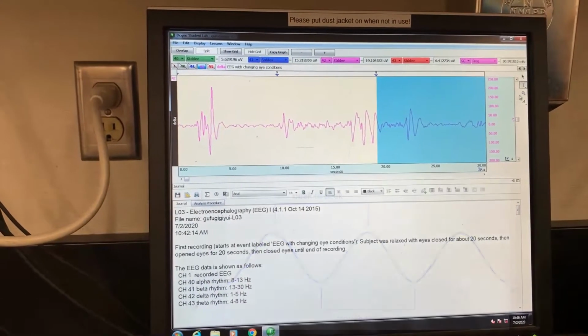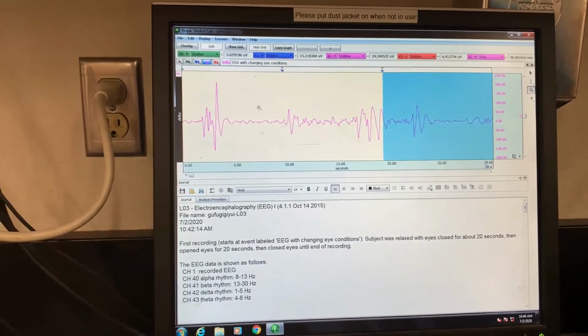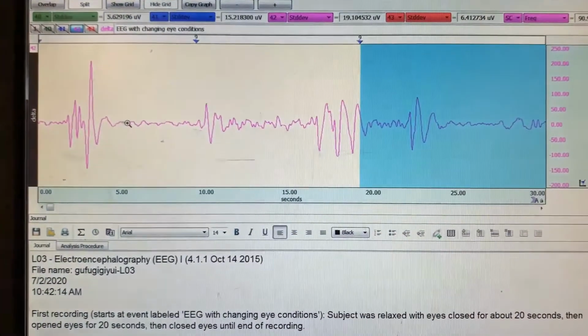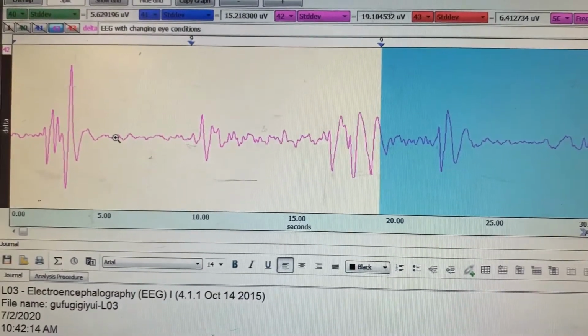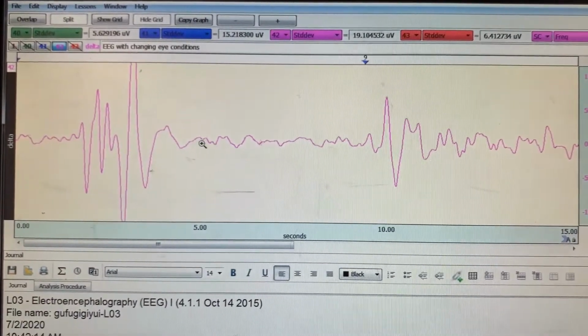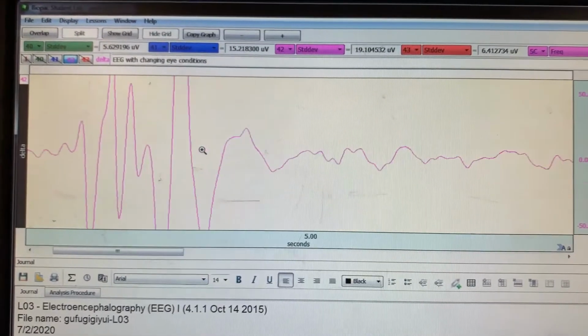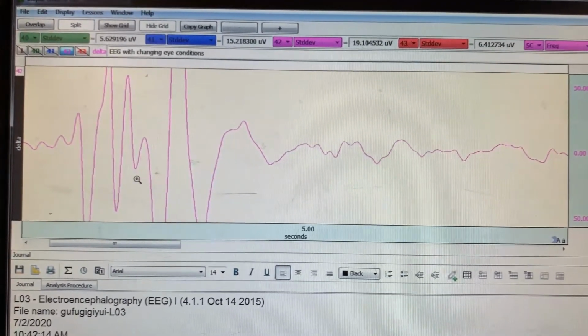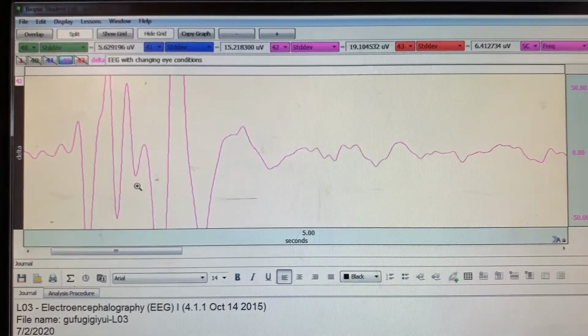So I'm going to take my magnifying glass, and we want to make sure that we do this in the first segment. That's our control segment. So I want to magnify from the 0 to 10 second data a couple times here so that I can see peak to peaks and trough to troughs so that I can measure the wavelength data.